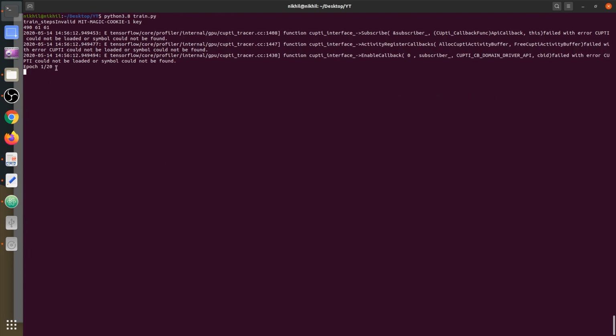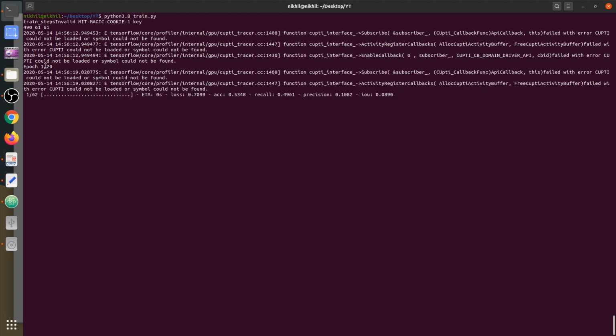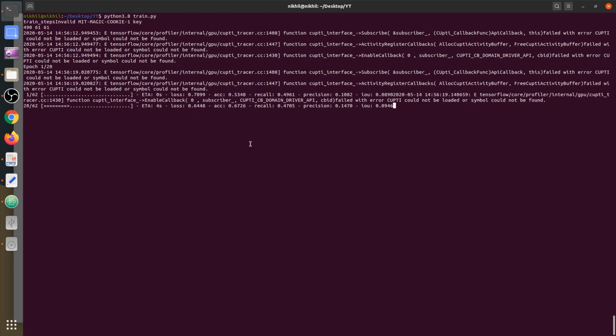Okay, so I can see epoch 1/20. So training, I think training. Okay, training has started. This is a good thing for us.